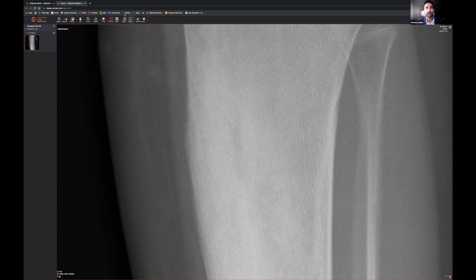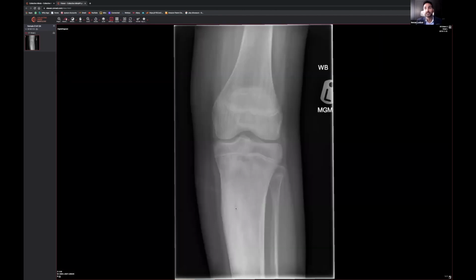So when you've got periosteal reaction, you've got to start thinking there's something more going on than meets the eye. You can have periosteal reaction in someone who's got a fracture. Sometimes you've got a fracture that's all the way down here, and then you've got periosteal reaction that goes all the way up the leg because the whole body is reacting, trying to fix itself. But this happens to be in context of this very, very abnormal area of bone texture that is sitting within this region over here.